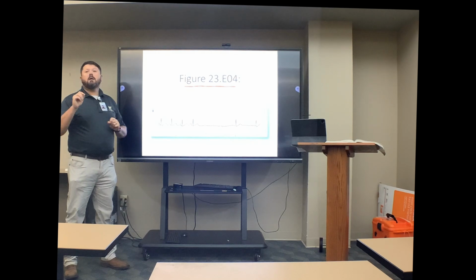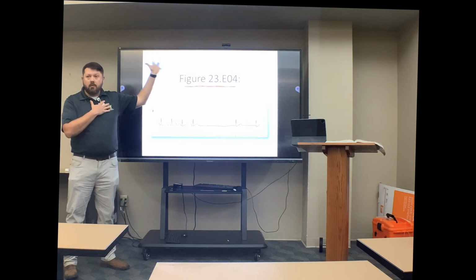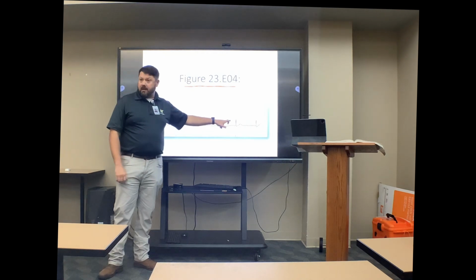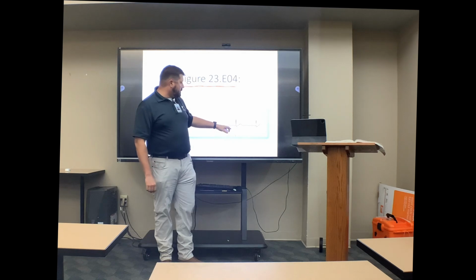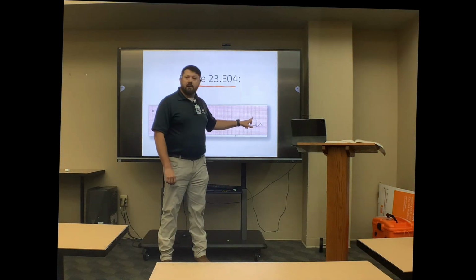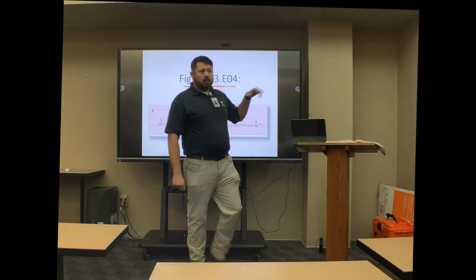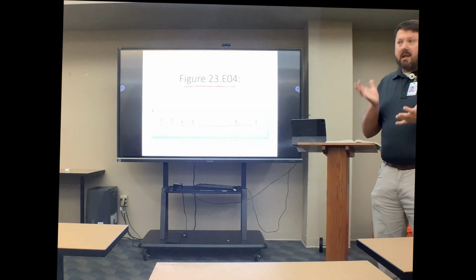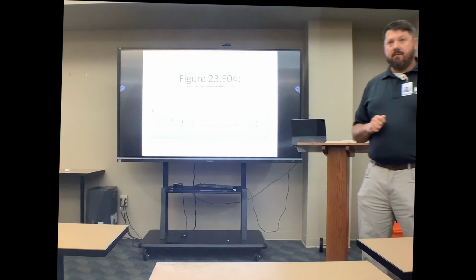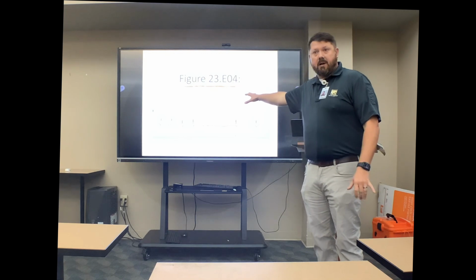Yes, that's 100%. Something happened with the SA node. The SA node was firing along, and then it croaked. It said, Lord, I'm coming home, I'm dead. And it croaked, and it went into a sinus arrest. Y'all seen this before, haven't you? And then you got one little failed attempt there, and then suddenly the AV node's like, well, we're going to die if he gave up just like that, so we're going to take over. And now the AV node, I mean, it occurs like that, right? At some point, that rhythm's going to transition to the AV escape, the junctional escape, right? You just happen to catch it on the monitor when it happened this time.